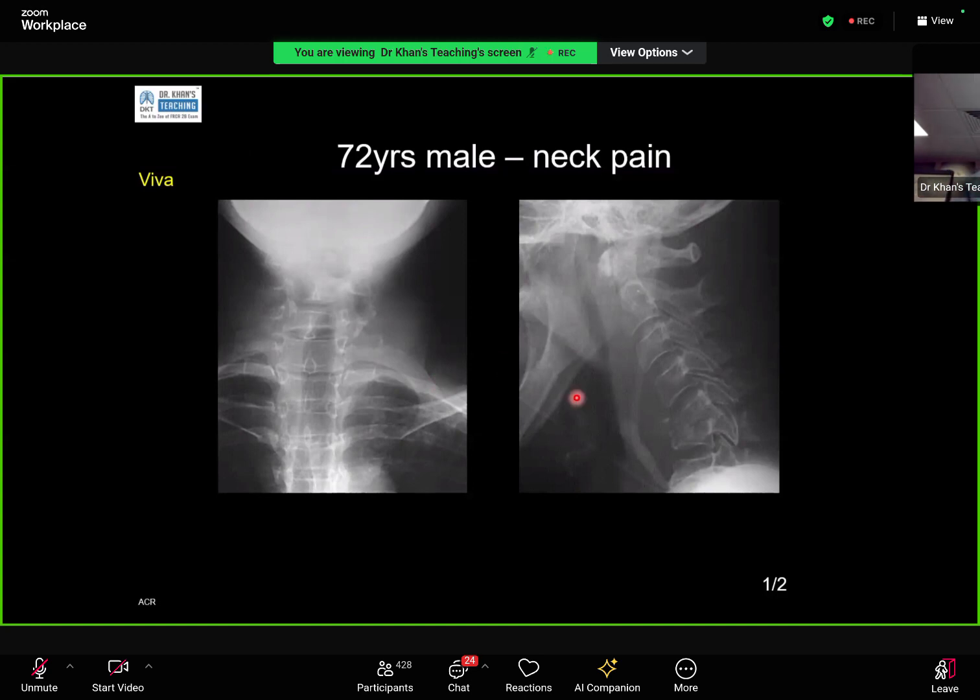Yes, please. Provided frontal and lateral projection of the cervical spine of a 72-year-old male patient with neck pain. The striking abnormality I can see is at the C5, C6 area. There is reduced intervertebral disc height and partial collapse of the C5 vertebra, with widening of the prevertebral soft tissue at C5, C6 and also extending up to the C4 to C7 levels.